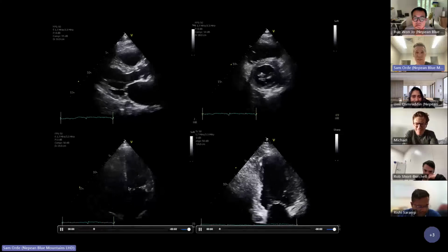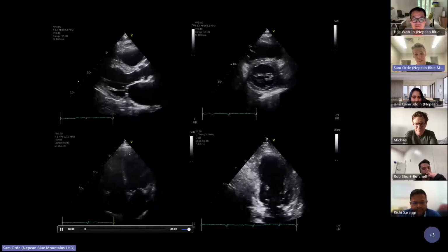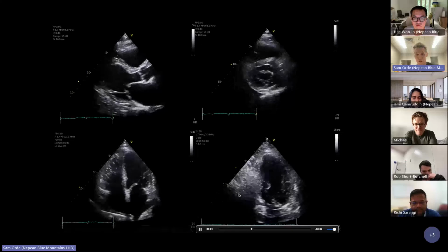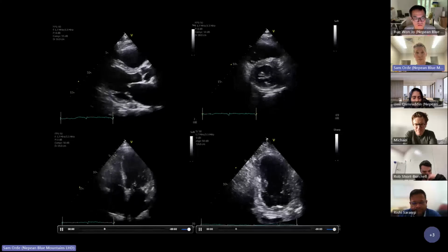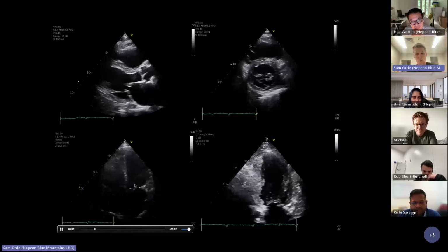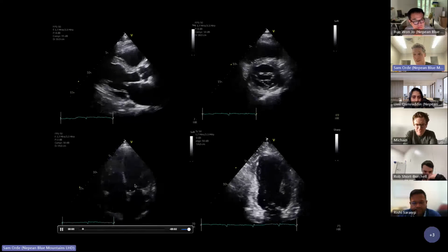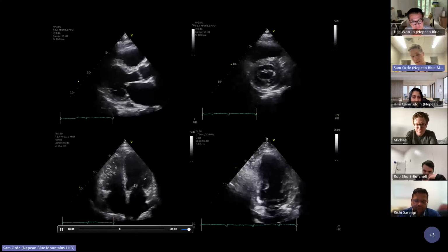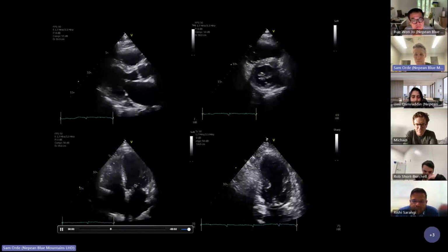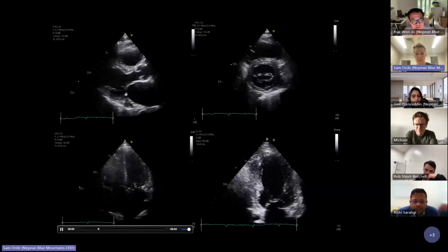The basic idea is that you're meant to be able to see the endocardial border throughout the cardiac cycle, and you've got to see that in the 4 and the 2 chamber. Ideally, you should have an optimized view for a 2 chamber, and the same for the 4 chamber, making sure you can see the endocardial border throughout the cardiac cycle. You don't want to be guessing. We need to ignore the trabeculations, and you either ignore the papillary muscles or some people include them. As long as you're doing the same thing every time, you should exclude the trabeculations and the papillary muscles, in my opinion. That's what the guidelines say, and measure it as accurately as you can.